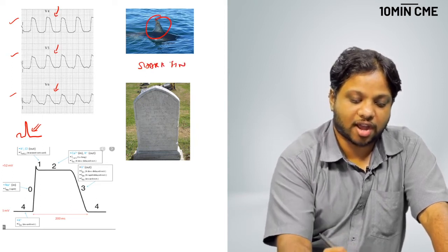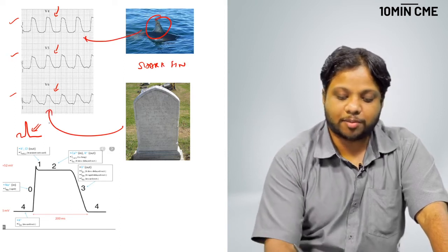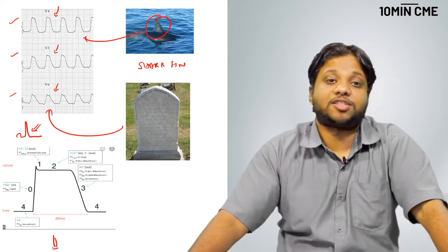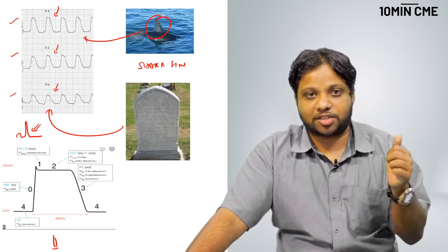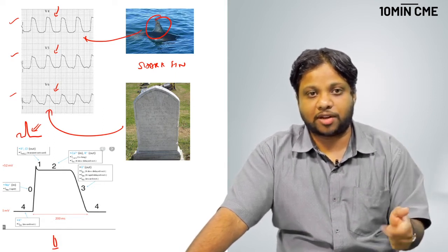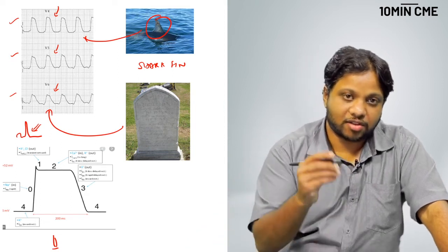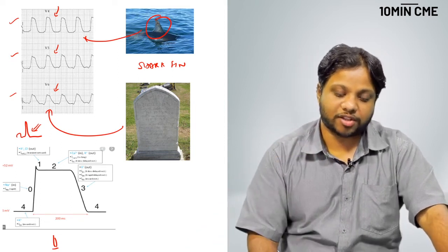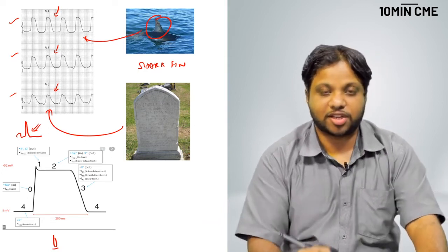You can see it mimics a shark fin. It's also called the tombstone pattern, and some people also call it the action potentialization of the ECG. So it mimics a cardiac action potential. So 3 patterns: shark fin pattern, tombstone pattern, or action potentialization of the ECG. Whenever the descending limb of the QRS is obliterated, it is called a grade 3 injury. So we shall see that later.